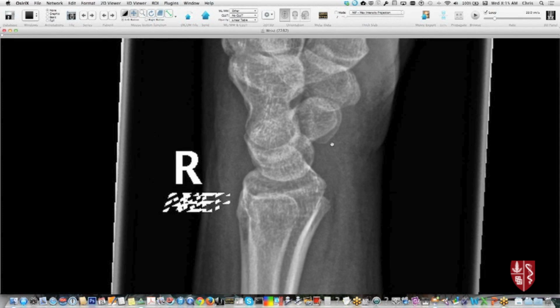And those are things that the hand surgeon would decide about whether or not to try to improve on that alignment. Coming back to that scapholunate, okay, so here's dorsal, here's palmar, and if you look at the lunate here, it's a little bit tilted dorsally, right? Here's the capitate, which sits in the lunate. We won't get into it, but you can talk about the angle between the capitate and the lunate as well. So the lunate's tipping dorsally. Here's the scaphoid here. I'll just kind of cruise around the borders of it. And if you just draw a long axis either through the middle of it or along the palmar cortex of that scaphoid, I think it's pretty easy to see that that's going to be more than 90 degrees.